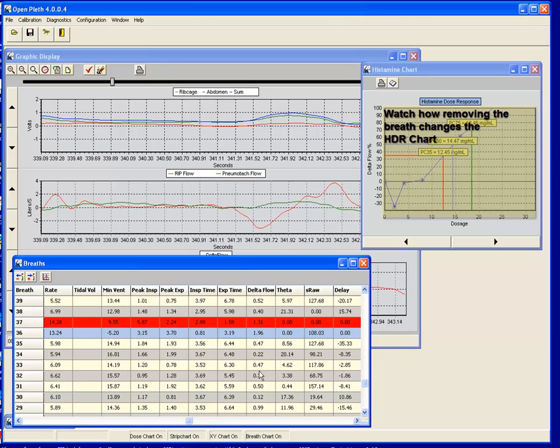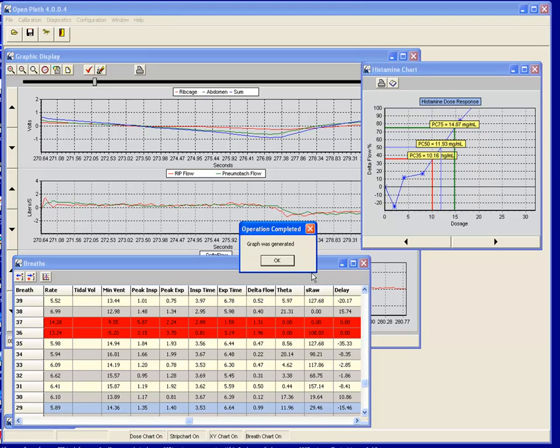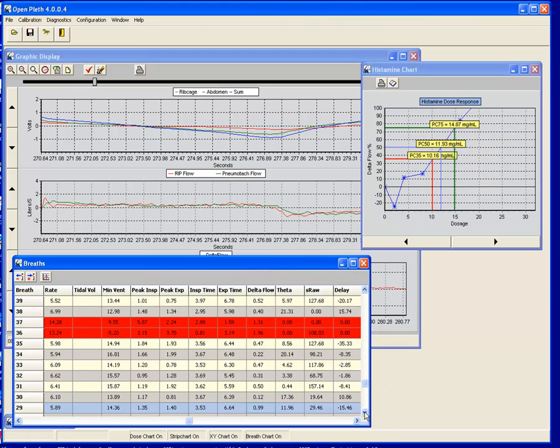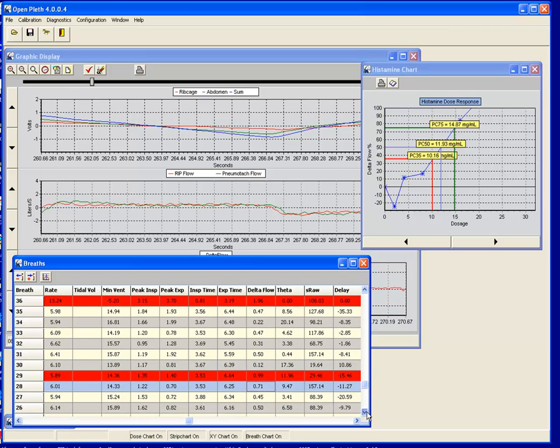All right, so let's go down, and I'm just looking at some that are questionable. This one here, I guess, might be questionable, might not be. I'm just going to go ahead and delete it for now. And then go down a little bit further to see. That one looks okay.